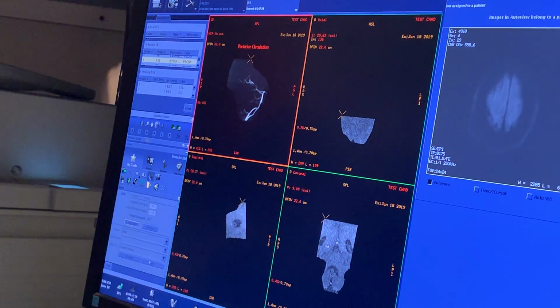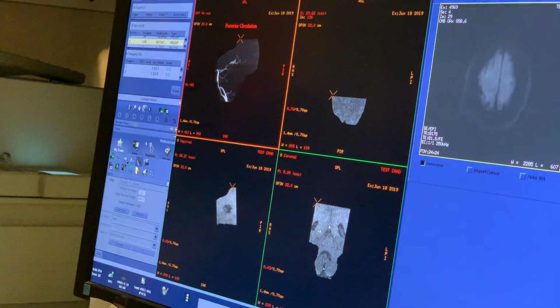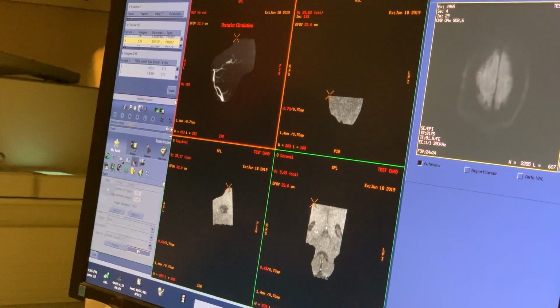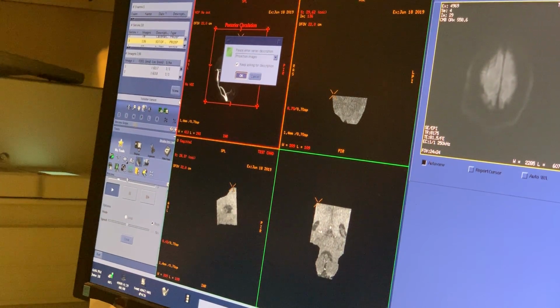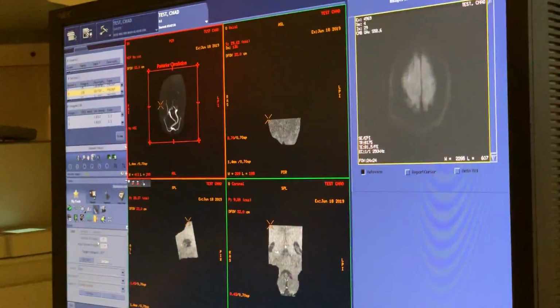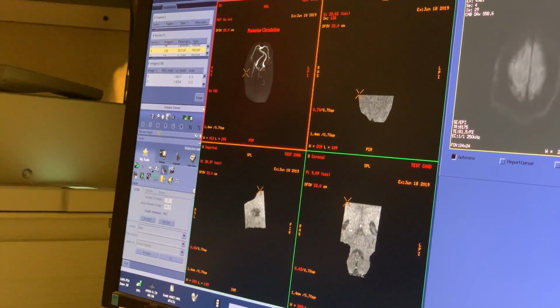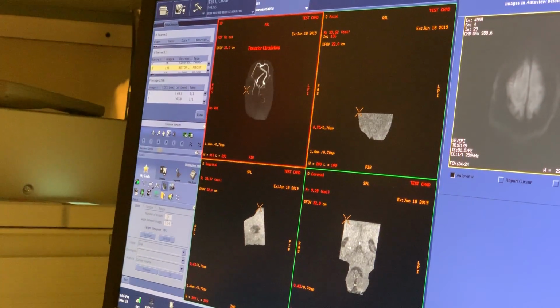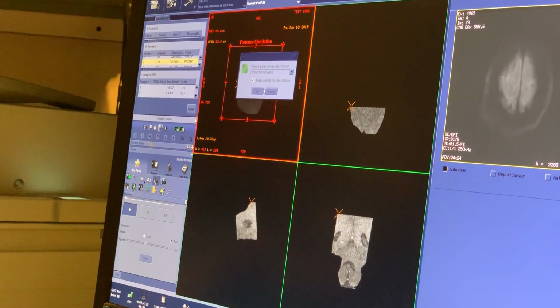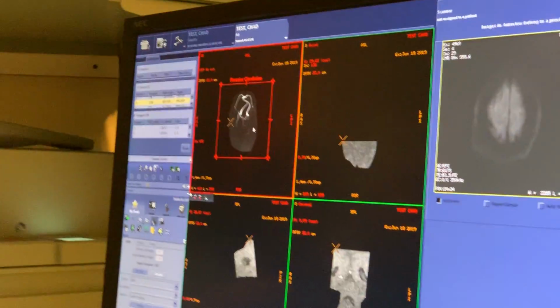All right, so I'm going to start this, go to the left side, end it, and then type in 36. Hit OK, and then OK. And now I want to go from superior start set to inferior end set, and then 36 again. And click OK, and then OK. And that's it, you're done. So that's the method of cutting out a brain.